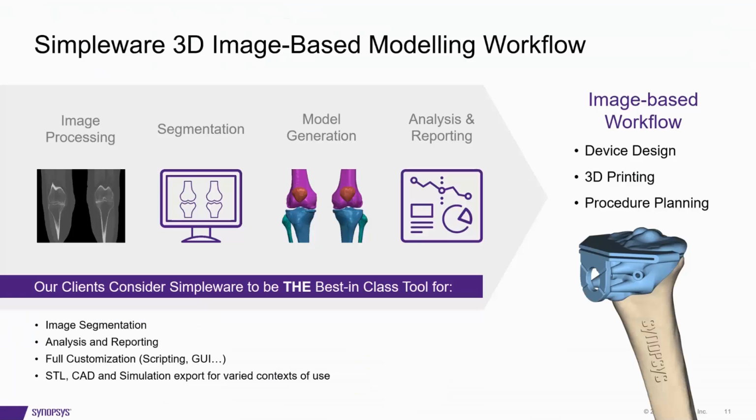So just as a quick summary, I wanted to bring up this workflow slide again, just to recap. We imported the patient's CT image data of their knee. We segmented it using the knee CT tool from Simpleware AS Ortho, and we exported both the model and the landmarks ready for Entopology to use in their design process. So now I'd like to pass back to John and then to Christopher, who will explain the design process of that patient-specific cutting guide.